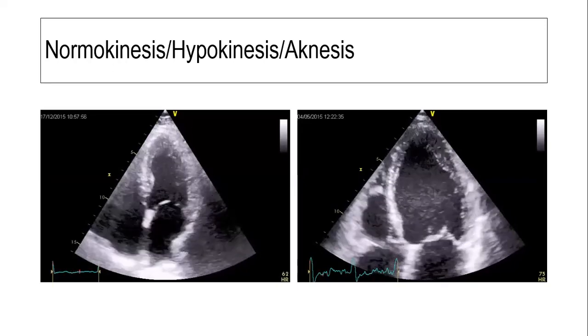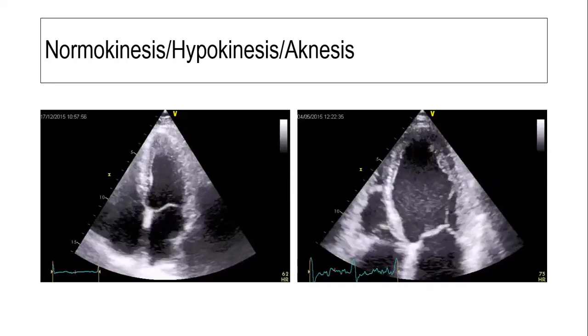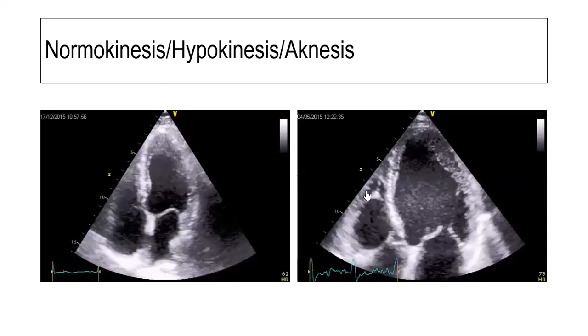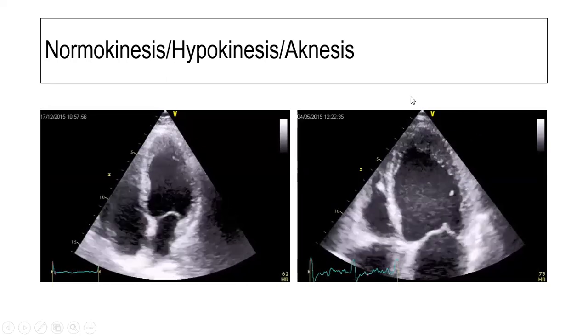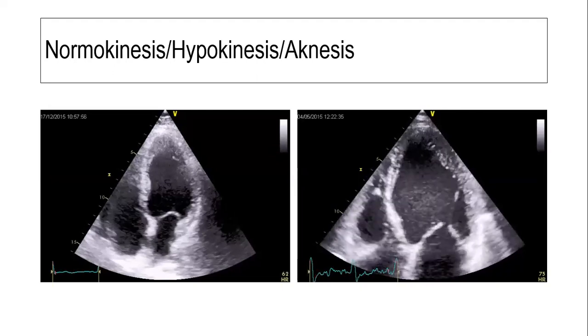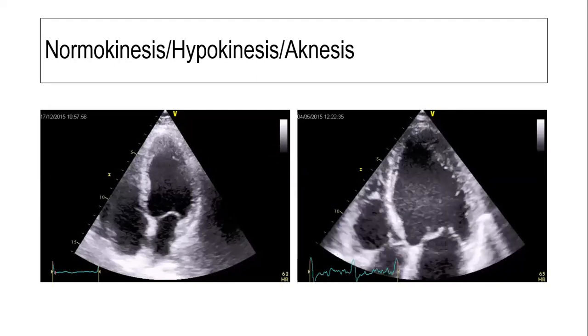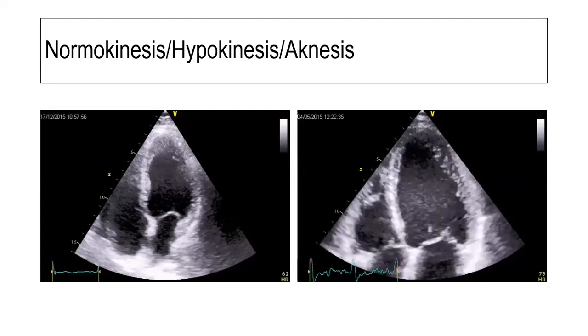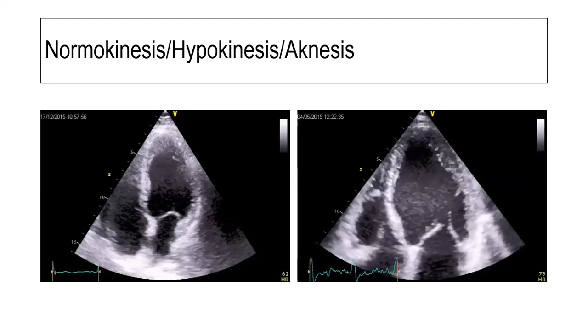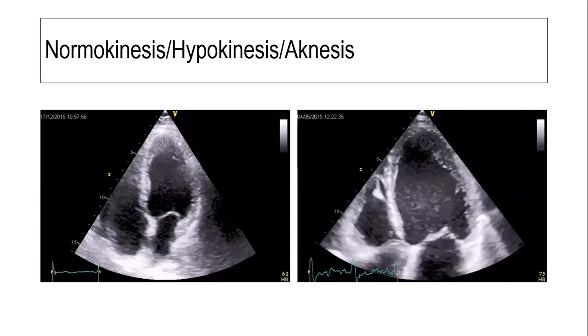A little bit hypokinetic. Speak loudly, Ghanshyam. Sir, a little bit hypokinetic. There is no word "little bit." You have generalized hypokinesia. No. First of all, you should say hypokinetic, akinetic, dyskinetic. I always say these words when we talk of hypokinesia. There is nothing like mild hypokinesia. There has to be hypokinesia, or there is no hypokinesia.